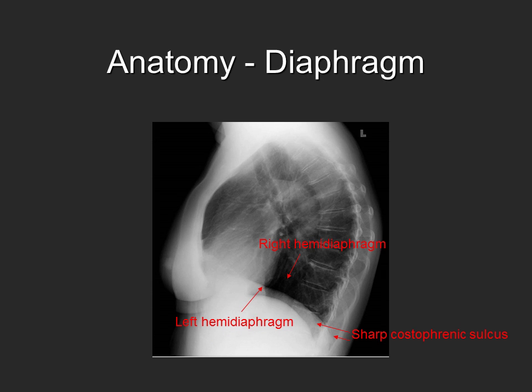On the lateral view, notice that the heart sits on the left hemidiaphragm. This can help differentiate between the left and right hemidiaphragms.